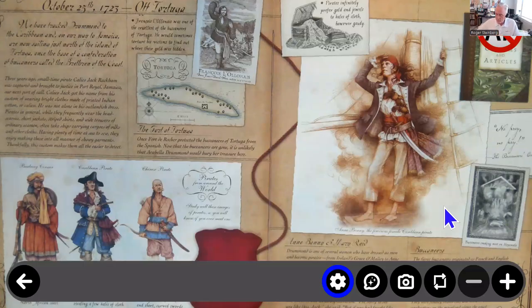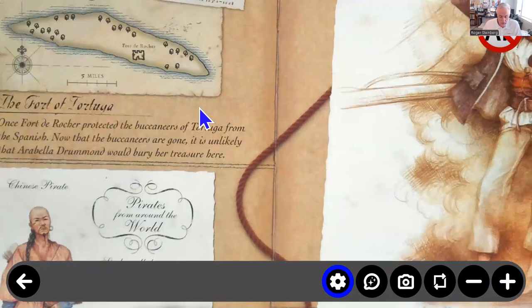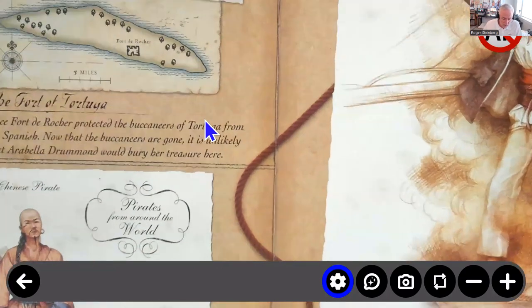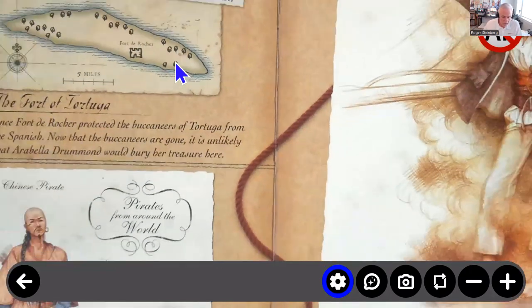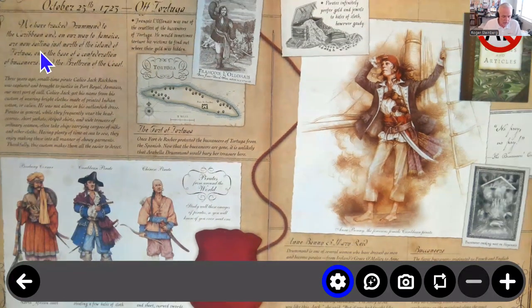So very quickly, I've put a document under here. I've specifically chosen one that would be a very difficult layout for you. So for those of you that have used optical character recognition before, you can see that this would be probably very difficult text to access with OCR. It's not really good with uncommon fonts like you see in the upper left there. This is actually 2 pages of a very large book. It's about a 24 by 14-inch book. Both pages are viewable underneath my Solo 8 camera here.